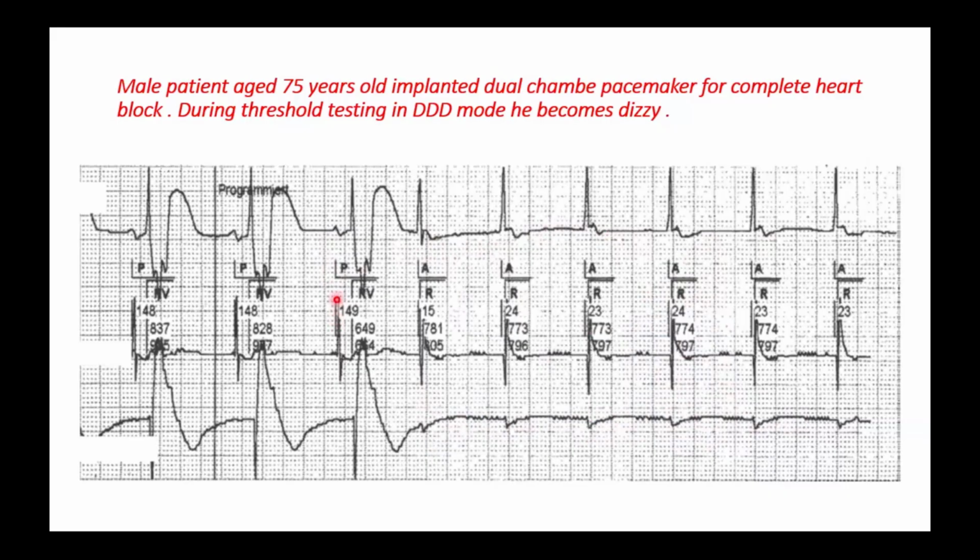While during atrial sensing, there is no such problem. So this is the definition of AV crosstalk: the ventricle senses the atrial pacing. Interrogation during testing is very important. And in some machines, you have to choose dual EGM so that you can see the atrial EGM, the one on top, and the ventricular EGM, the one under.